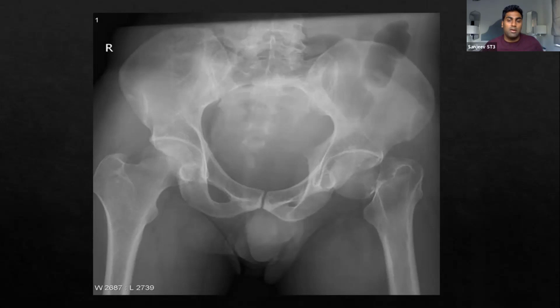Yep, that's fine. So remember, go through your mnemonic. Have you described the pattern? You said transverse, absolutely. Anatomy, so you said intracapsular femoral neck, and you said left as well, which is really good because there are 2 femurs, so it's really important to say that. Intra-extra-articular, probably not as relevant here, I agree. Deformity, that's the main one. Okay.